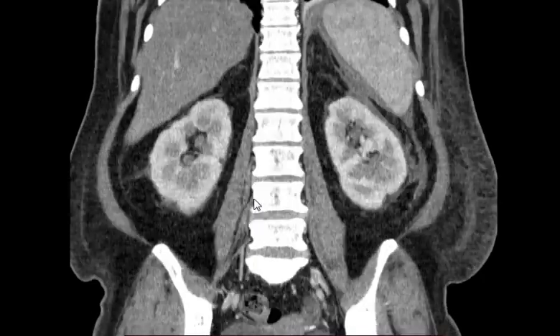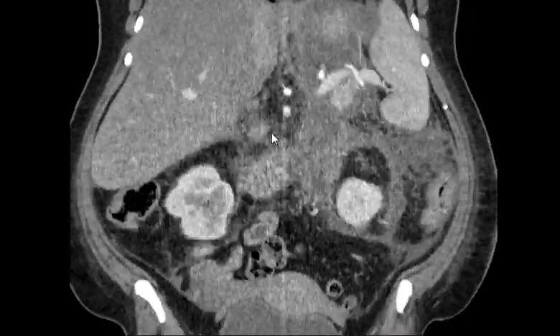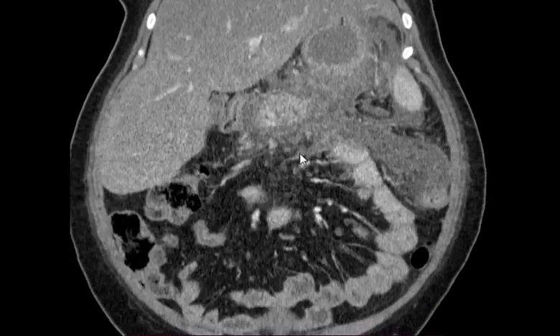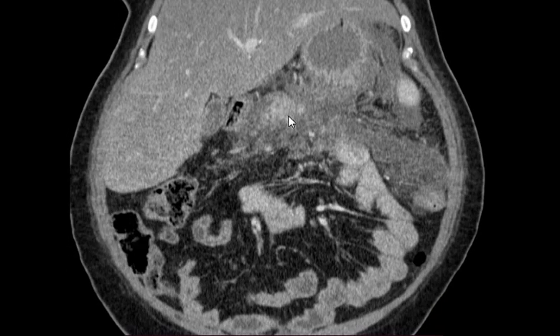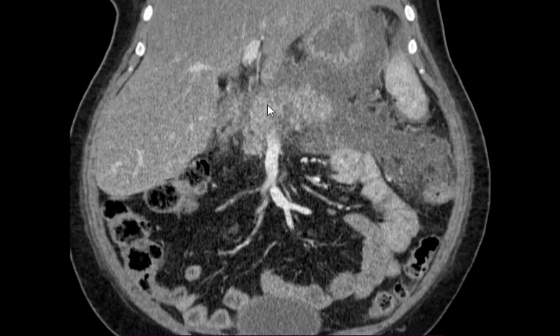And what about pancreatic carcinoma? There's no mass seen here or any dilatation of the duct. What is the most common presentation of pancreatic carcinoma? Adenocarcinoma, most cancers of the pancreas are adenocarcinoma. Present with what? Clinically, not radiologically: obstruction of the duct. It's painless jaundice. Painless jaundice of the pancreatic head is carcinoma until proven otherwise.